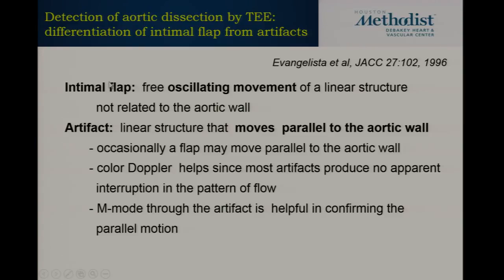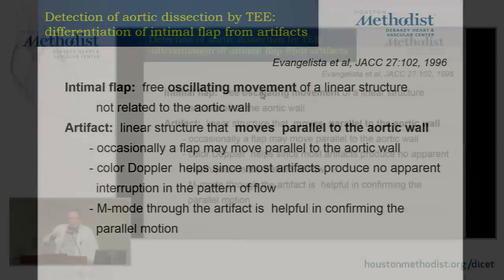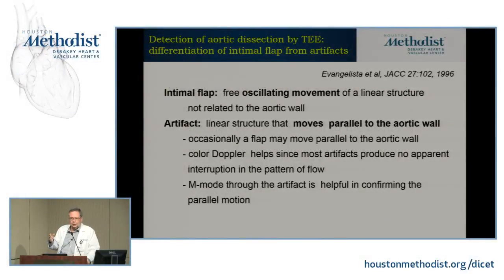So intimal flaps are free oscillating. They have a free oscillating movement independent of the cardiac cycle. Remember, the aorta is a vessel, and it's going to move a little bit like this with systole and diastole, whereas the flap inside is just doing its own thing. It's dancing at its own rhythm. It's not following the aorta.